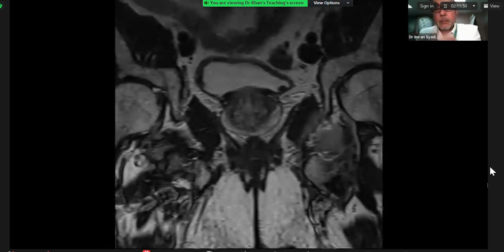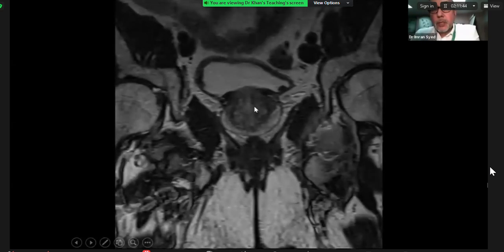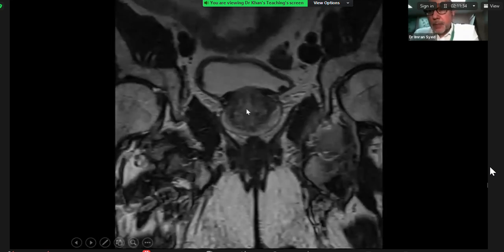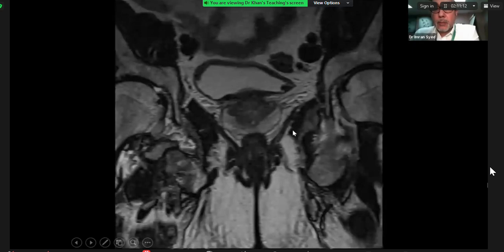Now, for those of you who do prostate imaging or have seen prostate imaging, you often see a central median lobe, which is a common finding that projects into the bladder lumen, and that is a common feature of BPH, as we all know. The rate of malignancy in a median lobe is incredibly low, so prostate cancers very rarely affect the median lobe. So you may well see features that appear to be pathological, i.e. restricted diffusion on the DWI, but this is a take-home message that median lobe tumours are incredibly rare.